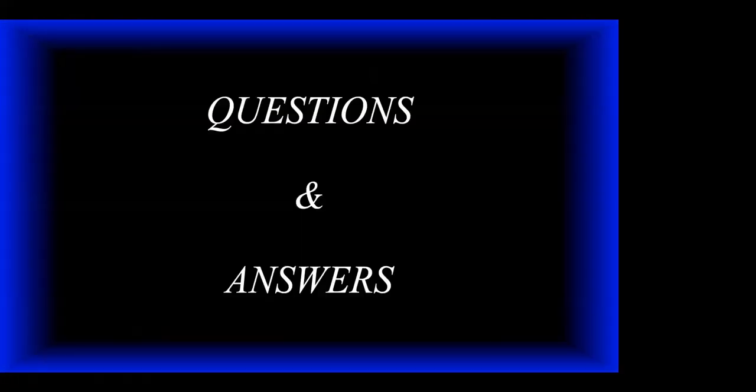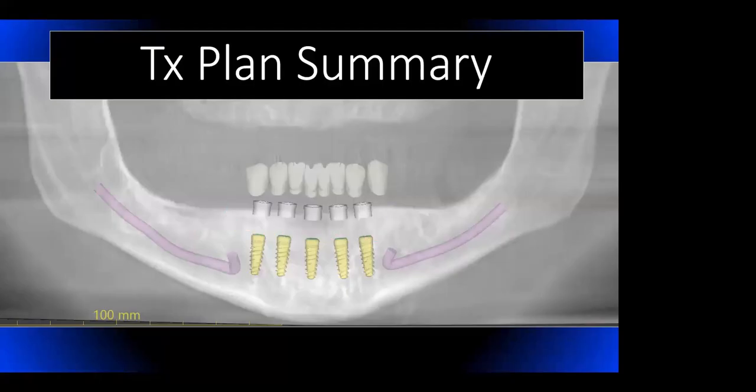So again, in summary, on this case, you have the ability to do anything that you want. The A and the E position, I showed you that case. If you're going to do 2 implants, the BD is a lot more favorable. A and E gives you that anterior and posterior cantilever effect, and it's going to teeter-totter on you. So the BD position is more ideal.